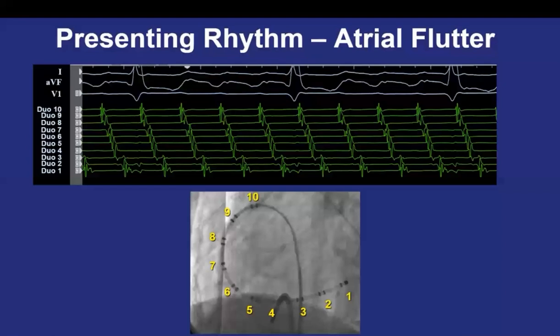What about the pattern VAAV? During pacing, if you have atrial tachycardia and if you pace, the VAAV is a differentiation between the atrial tachycardia and other forms of narrow complex tachycardia like AVNRT or accessory pathway, not with the flutter. Flutter is always a VAAV. Actually, flutter with VAAAV.